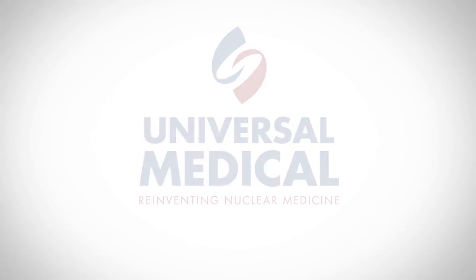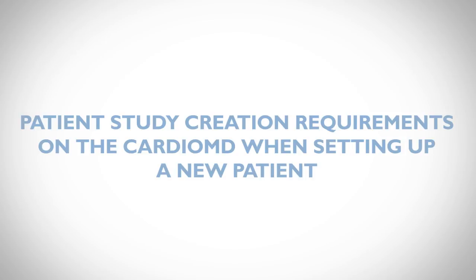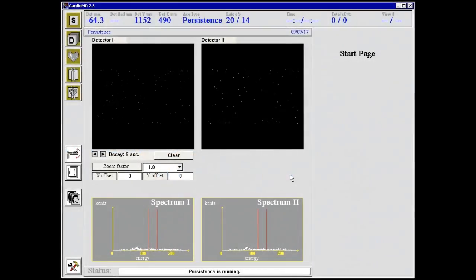In this video, we will be discussing the parameters required when setting up for a test patient or study on the CardioMD acquisition station. In order to set up a new patient on a CardioMD, you need to choose a study type: static, dynamic, MUGA, SPECT, or gated SPECT. I will use the simplest, which is static.